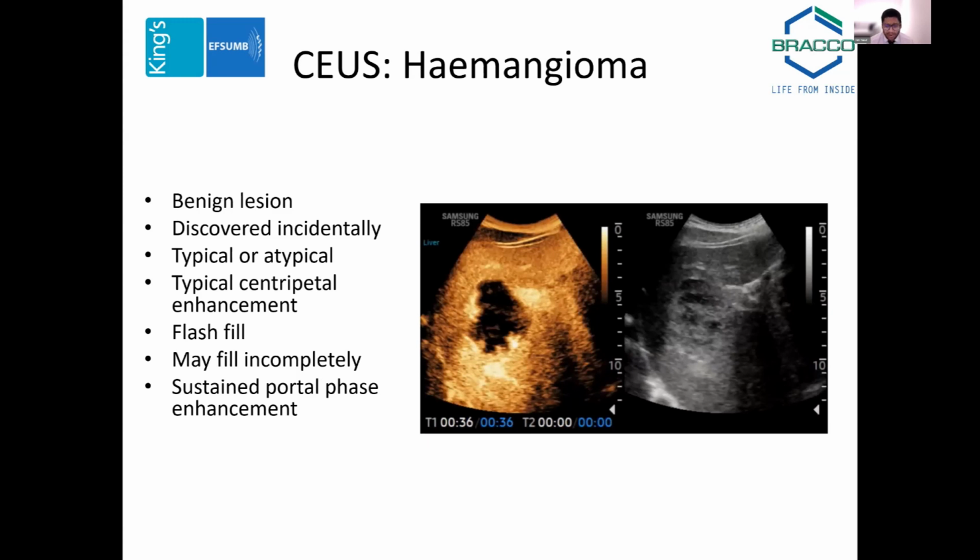They peripherally nodular fill, the gradual infilling. They may not fill completely in. There may be a central scar with it that doesn't fill. But these are pathognomonic appearances, and they show sustained enhancement in the portal phase.